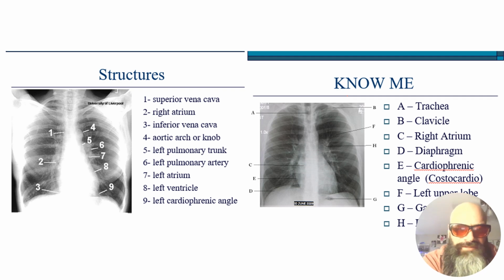If you ever find yourself lost when you're evaluating a pathologic chest x-ray, remember: trust normal. Normal is absolute, but abnormal varies amongst patients with presenting conditions as well.